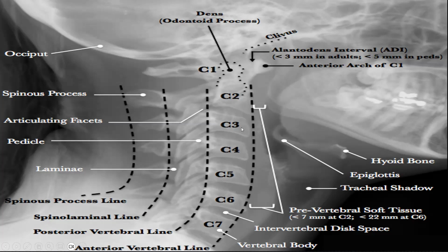So any problem in height, it means a fracture, compression fractures. Okay. So if the height in the anterior part is short, what does it mean? Wedge-shaped anterior fractures. Okay. And if the height in the center is short? Then compression fracture of the center.